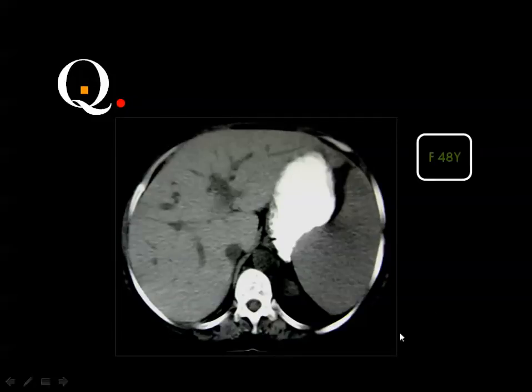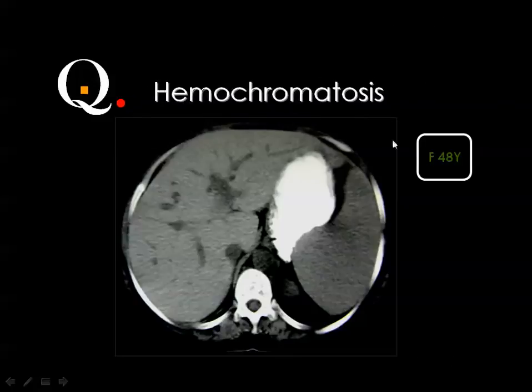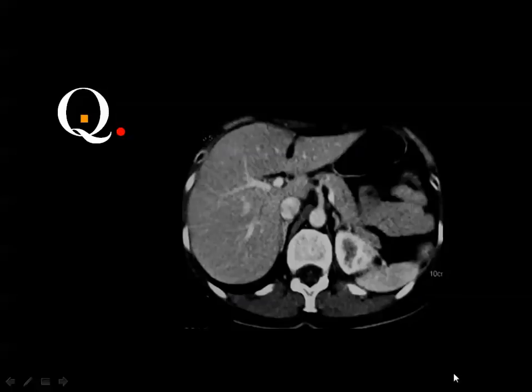This patient is not injected with contrast, and the liver is dense compared to the spleen, and this is like storage diseases or hemochromatosis or hemosiderosis. Then look here, and this arrow points to the artery, which is only seen coming from the anterior aspect of the aorta, and this is the superior mesenteric artery, and this is the portal vein at the porta hepatis, and this is the IVC, and here is the left suprarenal gland, and these are the intestinal loops. This is not the pancreas. The pancreas is here, and these are intestinal loops, and this is of course the spleen.